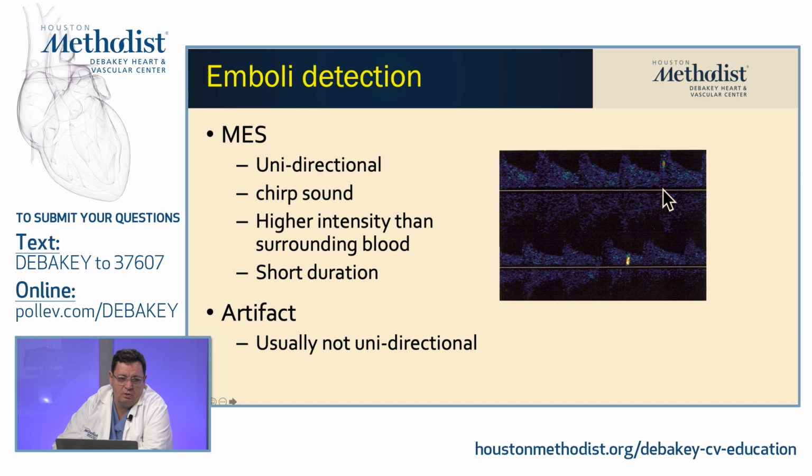If it's sitting on a zero line, the sound is deeper and it's just a thump. These are like a little higher pitch, crispy sound when you see these emboli going. With the snowing, you would expect to hear a little bit of blah, blah, blah. But in this case, again, we just couldn't have a sound recording done.